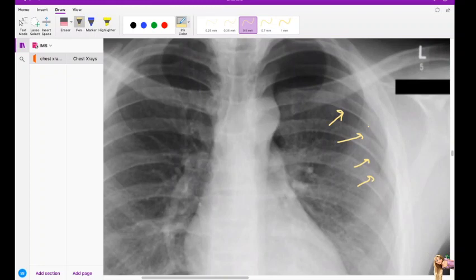So basically what has happened is there is air inside the pleural membrane. This is where the air has come, this whole area, and so the lung has pushed down over here. You can see this translucent pleural line, and beyond that you cannot see any lung markings. Over here you can see some lung markings, some whitish stuff, but you cannot see them over here.